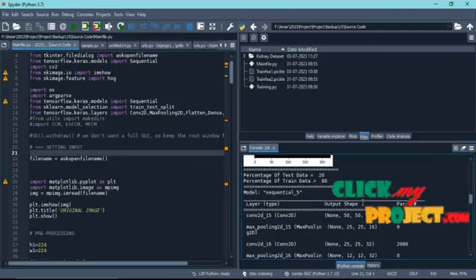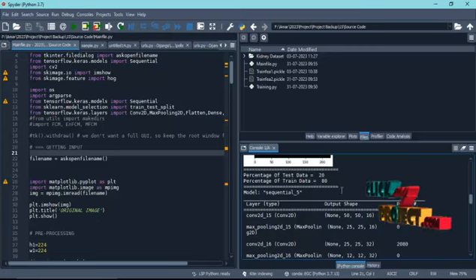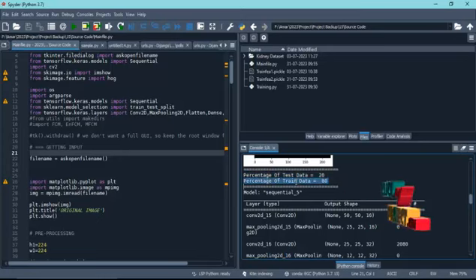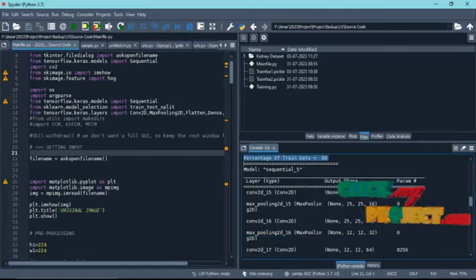After doing the segmentation, the feature extraction will be carried out. Before that, we have to separate the data into test and train sets. We have an 80-20 ratio for the test-train separation: 20% for testing and 80% for training. After this, the convolutional neural network is applied to extract the initial features from the image.